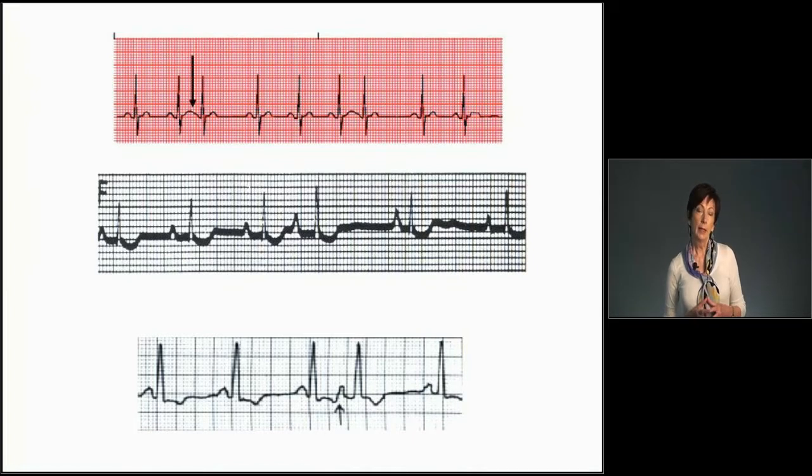But if you compare the T wave after the first QRS, right away you should be able to see that the second, quote, T is fat. And that's because it's distorted by the premature atrial contraction that produced a P wave that blended in with that T. So be sure that you look at the T waves and compare. And there's the second one that occurred a little bit past the middle of the strip.